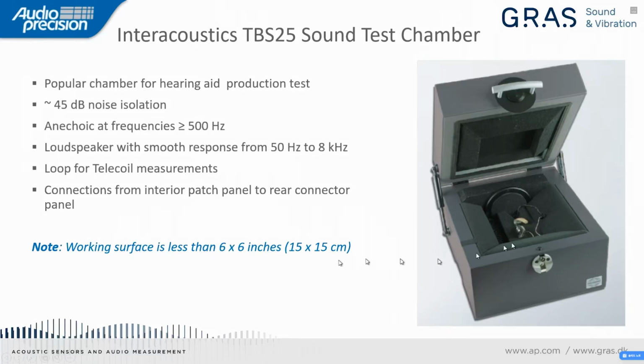I just wanted to point out here that the working surface is quite small. The area of that surface is less than 6 by 6 inches or 15 by 15 centimeters. Not very much room to work in, but luckily hearing aids are quite small and they fit well in the test space.